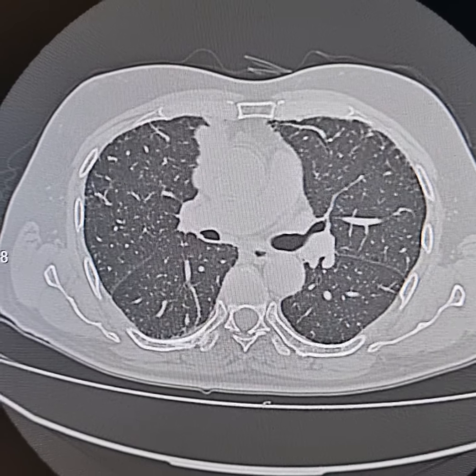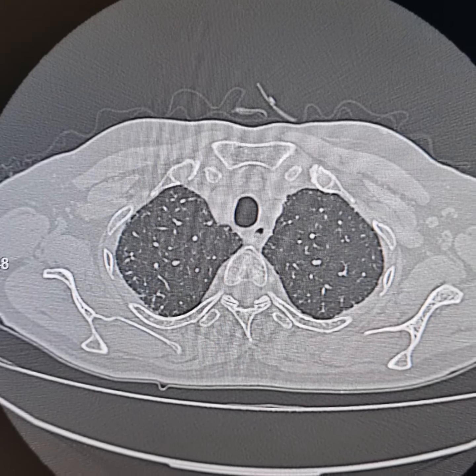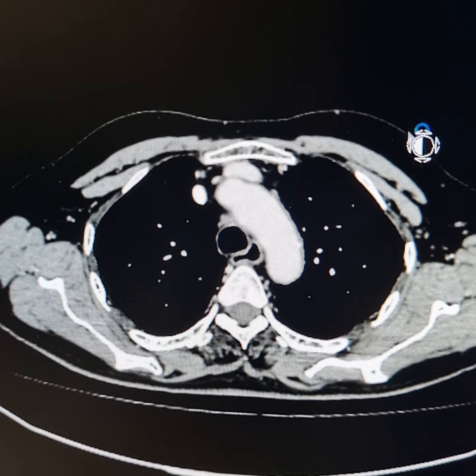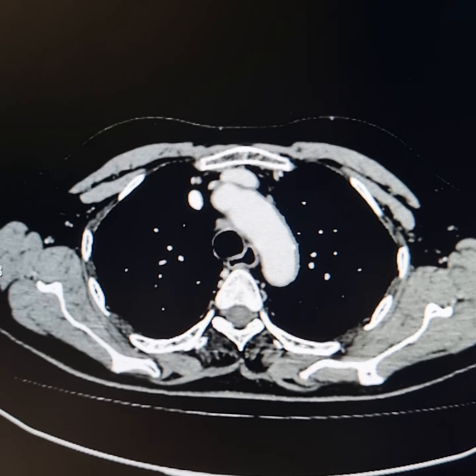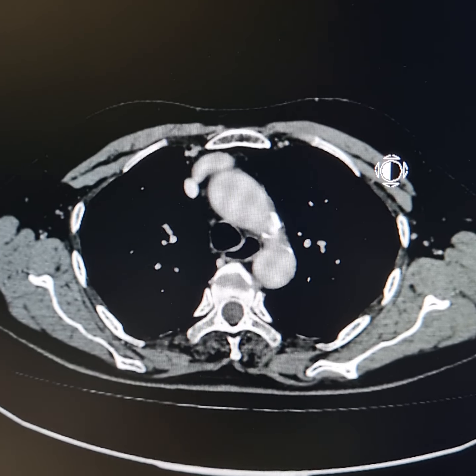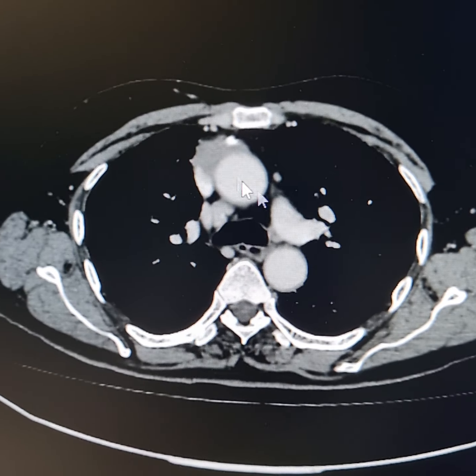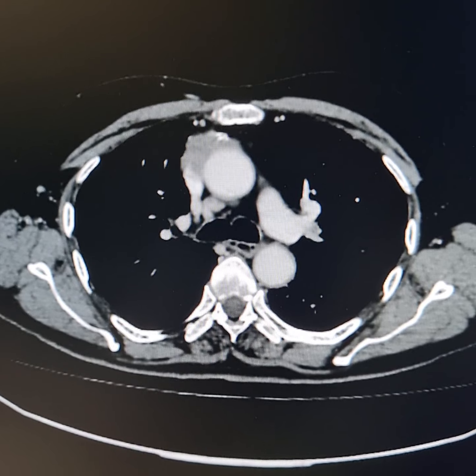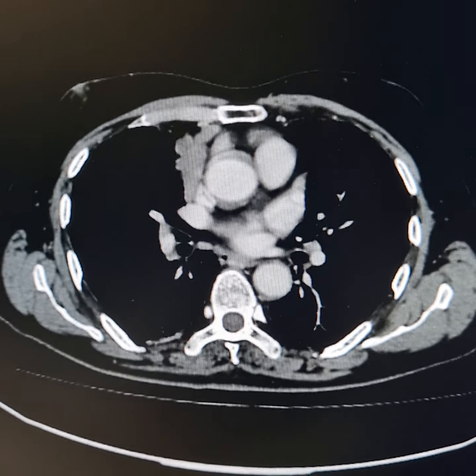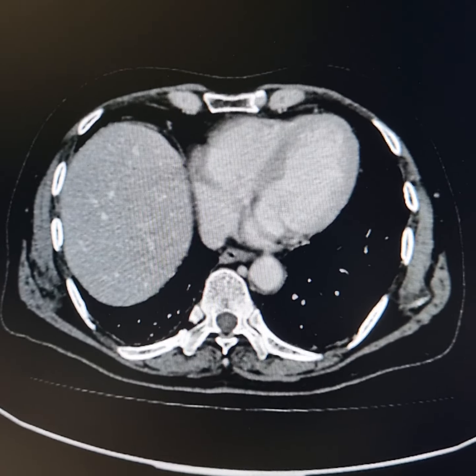So there is early interstitial lung disease, and the patient most probably has the invasive thymoma. The way it has partly encircled the ascending aorta, middle part of the brachiocephalic vein, and anterior part of the superior vena cava. This most probably is the cause of the myasthenia gravis.